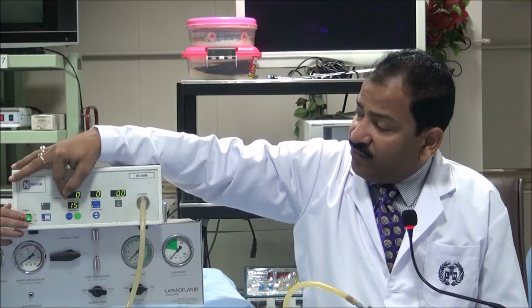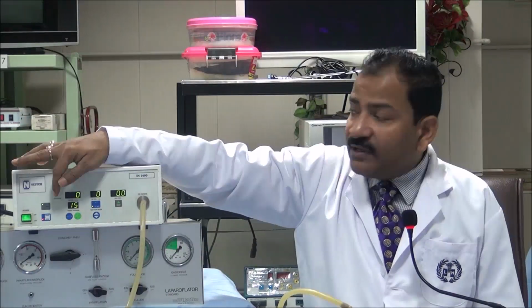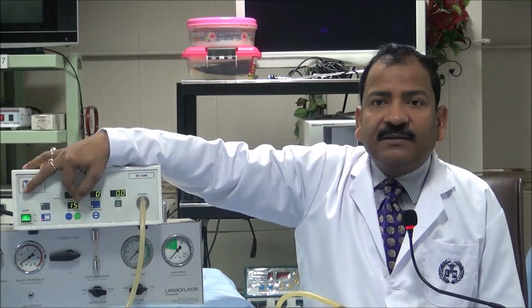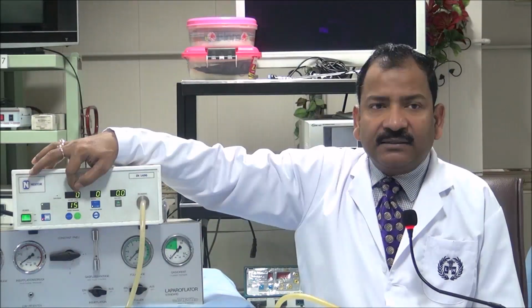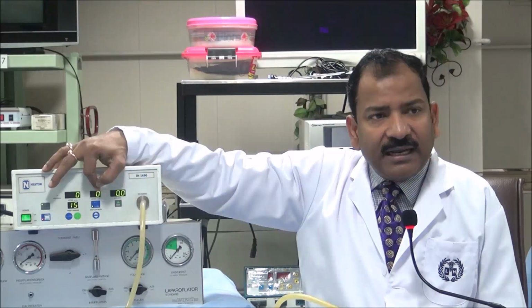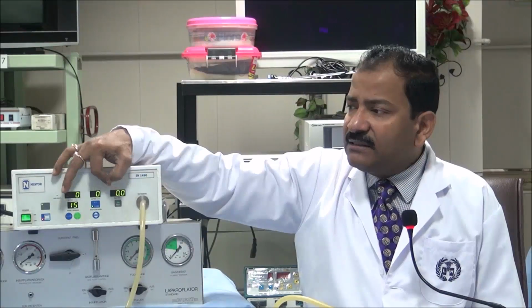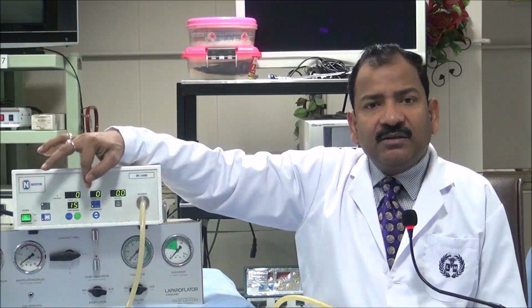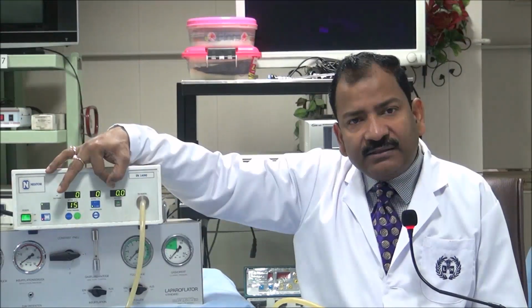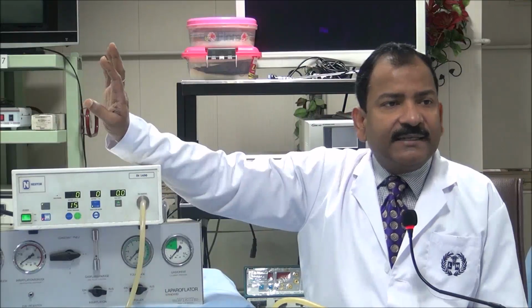Now it has 4 types of indicator. That is called the Quadro manometric indicator. The first indicator is called preset pressure. The second indicator is called actual pressure. The third indicator is called flow rate. And the fourth one is the total amount of gas used. Preset pressure, actual pressure, flow rate and total amount of gas used. This is called the Quadro manometric indicator. Quadro means 4, manometric means pressure indicator.